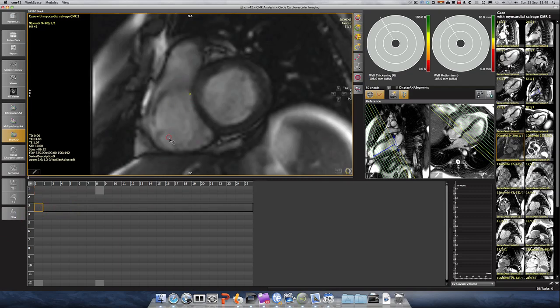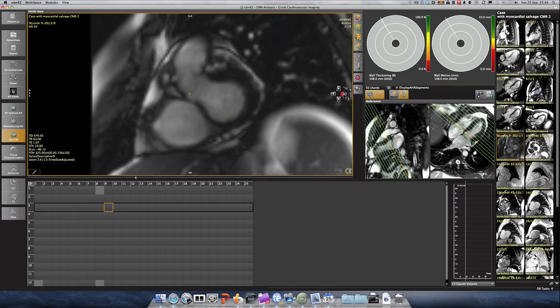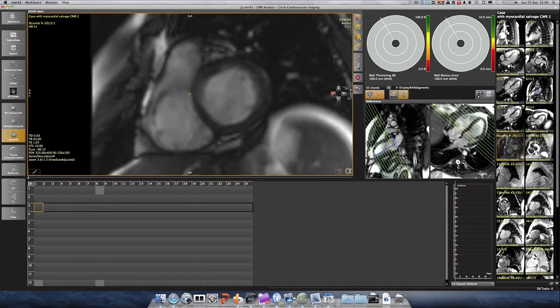So our first basal slice might be this. Now this looks much more like a shape of the right ventricle, and I'm sure if I click into systole, it'll get smaller first and then get larger when the atrium then comes in, and that's what often happens. So you can see it gets smaller, so that was right ventricle, and now it gets larger, and that's now right atrium. So what we see here is that this all is basically part of the right ventricle.